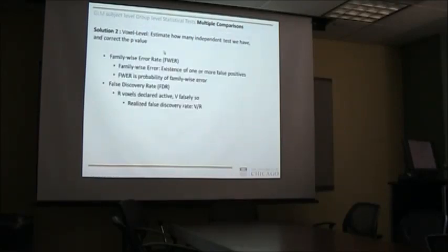There are two ways to establish what that exact p-value threshold, which again corresponds to a t-value or some other test statistic value, is. The reason I want to mention this is because you're going to see this in your SPM tables. You're going to see all these terms coming back, so to say.